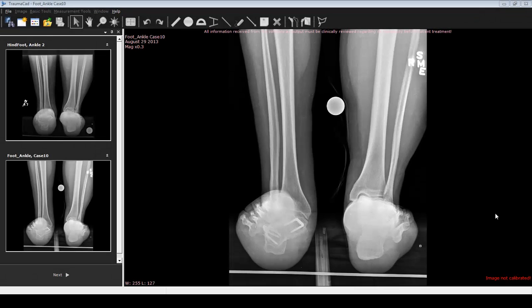This is Dr. Noman Siddiqui recording the demonstration on how to perform a TraumaCad evaluation for a patient with a hindfoot deformity. In this patient, TraumaCad can be very useful in planning because it can show how much correction needs to occur for it to be a more anatomical appearing foot. This clearly is a view that is different than most people are used to, and if you have the ability of obtaining this view, it is very dramatic as far as planning is concerned.